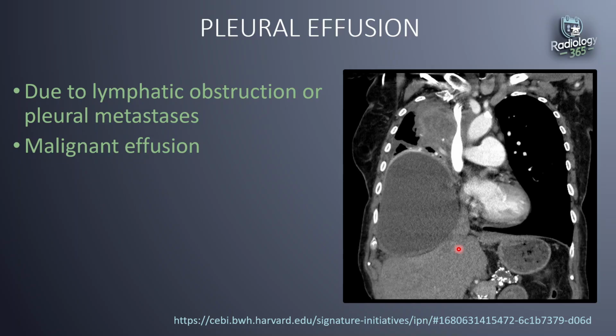So in this image, there is a partially necrotic mass lesion in the right upper lobe, which is consistent with a known history of lung adenocarcinoma. The superior vena cava is significantly narrowed as it traverses the lesion, and the right mid to lower zone demonstrates a large, likely loculated pleural effusion, causing inferior displacement of the adjacent diaphragm and elevation and collapse of the right upper lobe here. So this brings us to the end of this discussion.